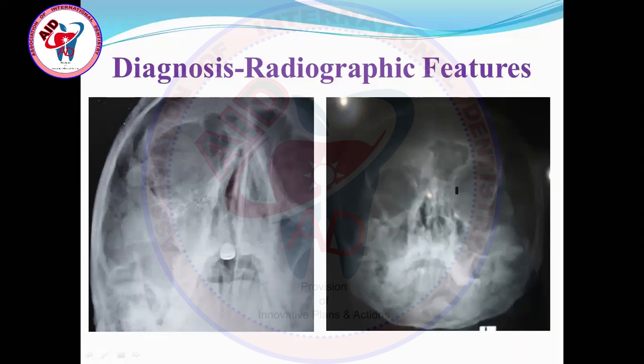And if you take an imaginary orbit, there is disruption at the lateral orbital rim, at the frontal zygomatic suture, and then also at some lower area. That is, this fracture segment is in between. There are two fractures of the lateral orbital wall over there, and this zygomatic bone gets displaced downward and laterally. It has increased the overall orbital volume.